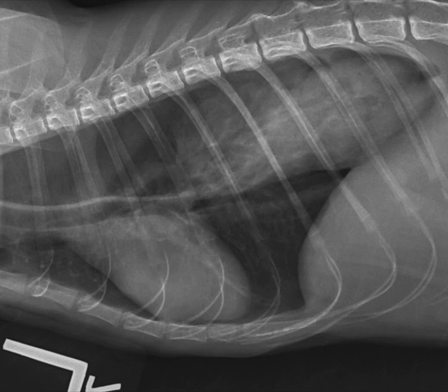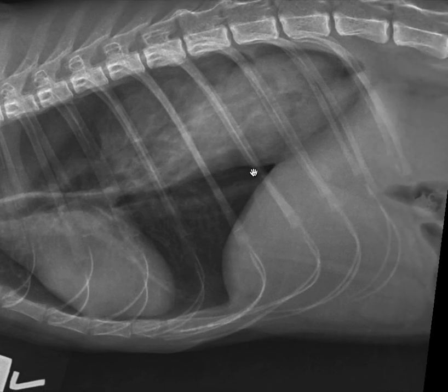So taking all these findings together, I've used the location, the opacity, the margination, and the size and shape between the different views to determine that I'm quite certain that I'm dealing with a diffusely enlarged esophagus and that within the esophagus there's additional pathology. For me, this pathology is quite likely to represent an intussusception of the stomach into the caudal esophagus. This is a rare condition, but it has been reported in cats. Other possibilities could include caudal esophageal foreign material or even a mass.